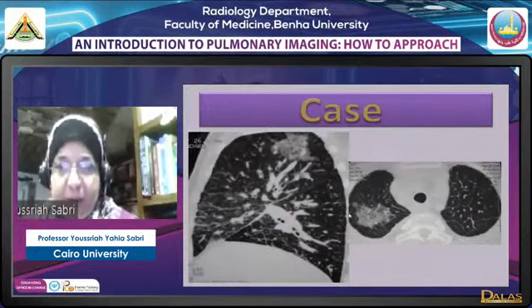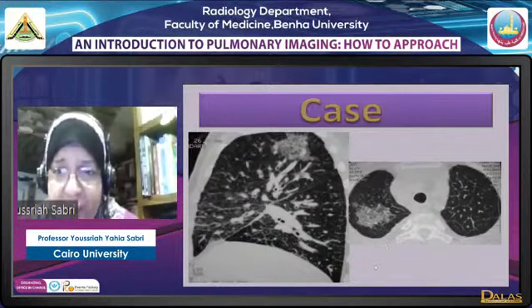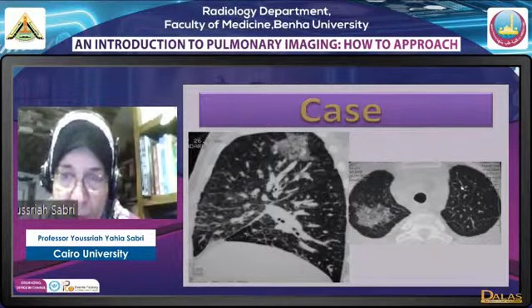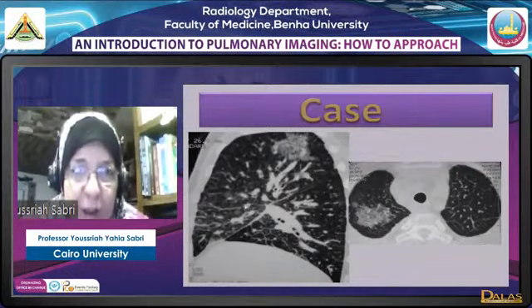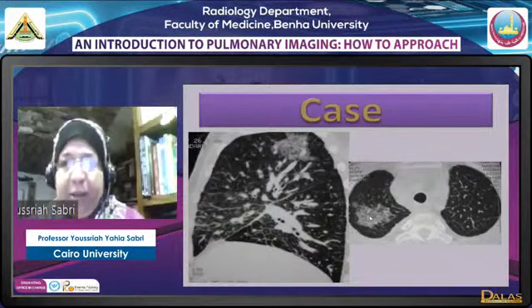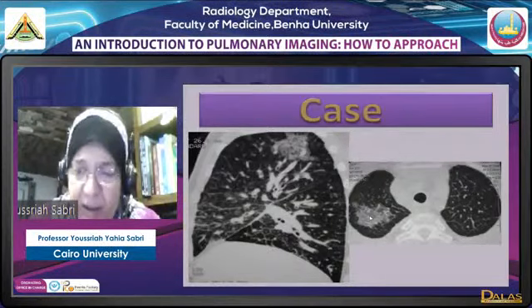We see it in cases of, number one, lymphangitis carcinomatosa. Here, as you can see, we have interlobular septal prominence, and at the same time we also have perilymphatic nodules. So in addition to the interlobular septa, we have beading of the fissure, we have centrilobular nodules, as you can see basally here, we have beading of the interlobular septa posteriorly if you look at the wall, and we also have prominent bronchocentric interstitium. This patchy ground glass opacity that you see is due to post-irradiation. This was a female patient with mastectomy, irradiation and chemotherapy.